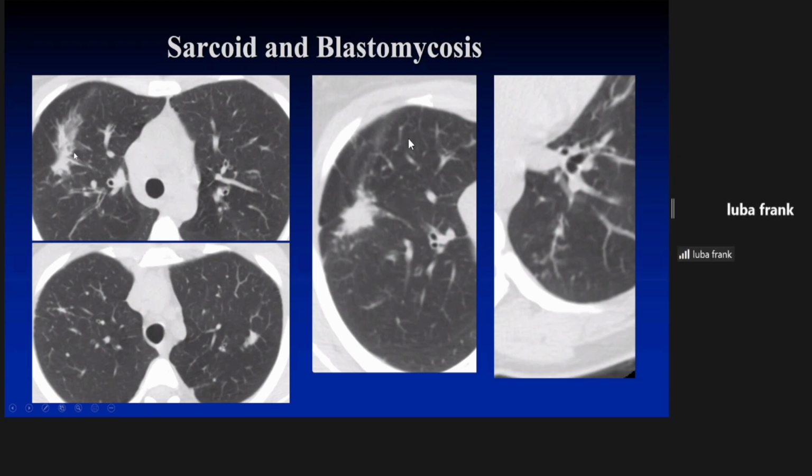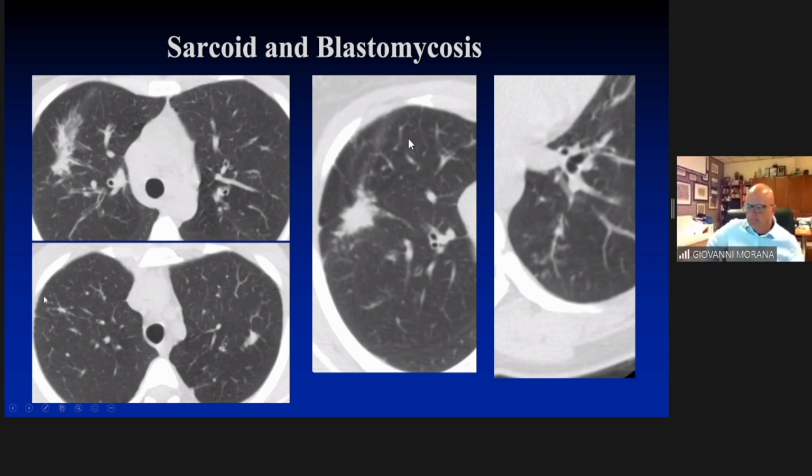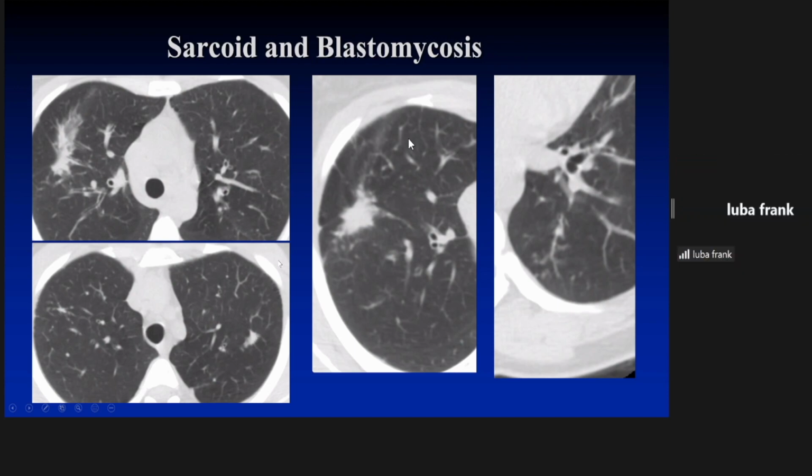So there's a solid component. The lesion definitely looks spiculated and very ugly. When we're looking at the additional slices, we do see that there's abutment and potentially going through or over the fissure. There's also a satellite nodularity around this dominant mass-like lesion. But there's also some subtle nodularity in the left lower lobe. We could talk about tree-in-bud nodularity, but there are also some solid and randomly distributed nodules. There's also parabronchovascular and paralymphatic nodularity.